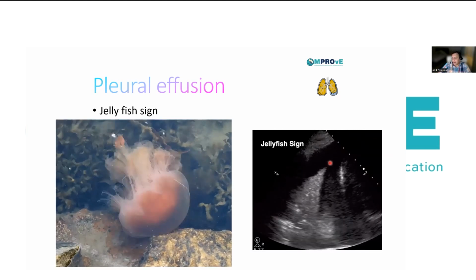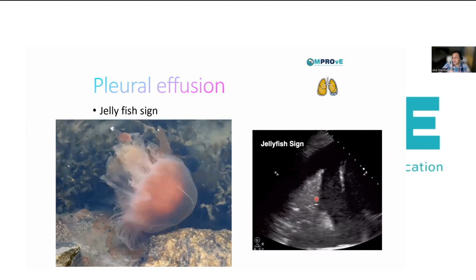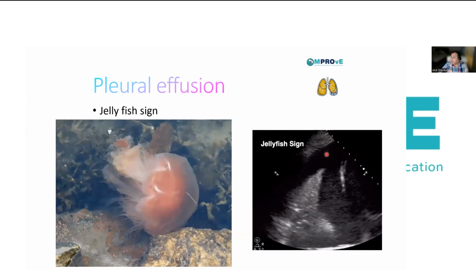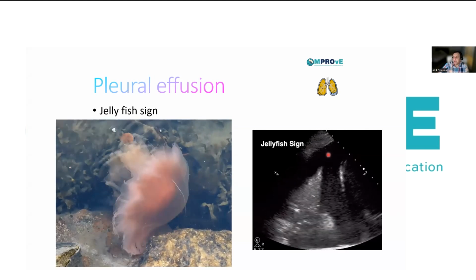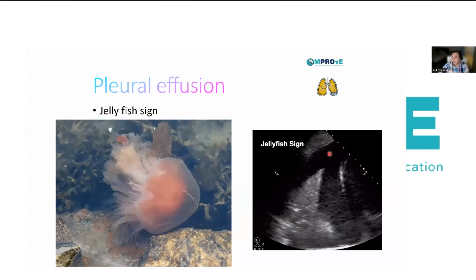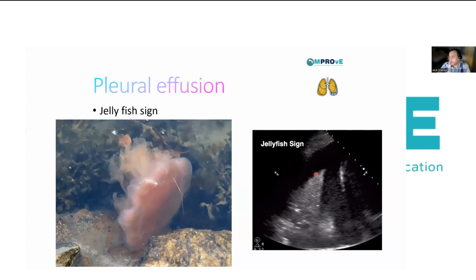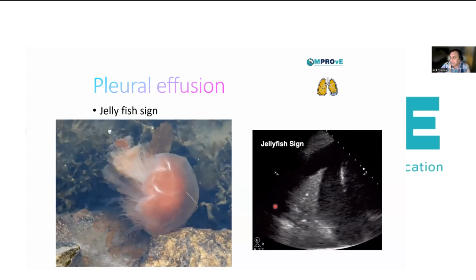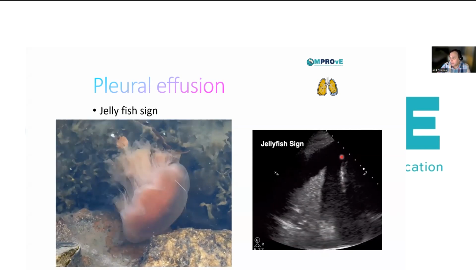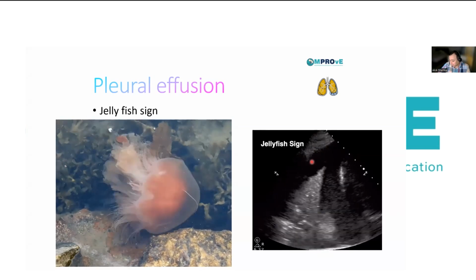But if you see dynamic air bronchograms, which appear and disappear, as you can see in this small margin over here, then it raises the possibility of air bronchograms moving in and out, which are more commonly seen with pneumonia. Now, if I clearly have a CRP of 50, 60, and I've got a baby that looks toxic, then from my perspective, I'd really be thinking about whether this might be a pneumonic consolidation. And then as I'll describe to you, if you can see debris within it, it becomes an exudate.